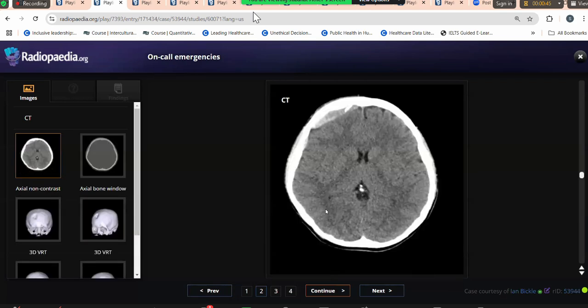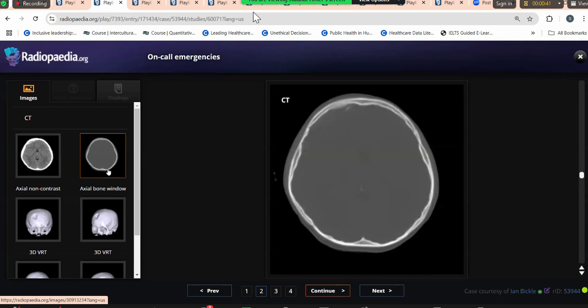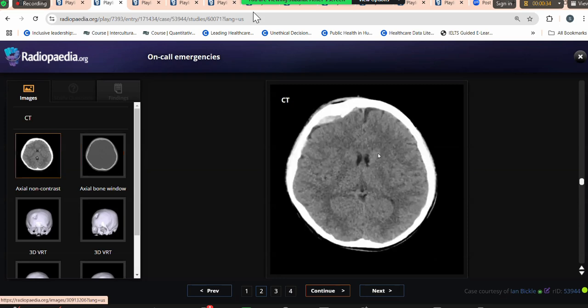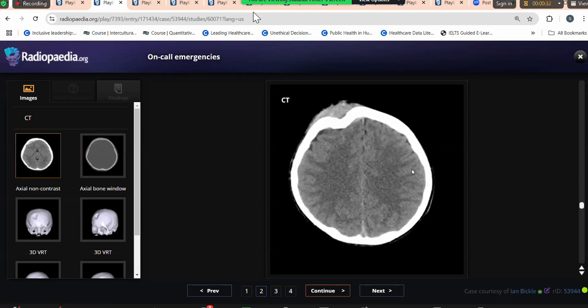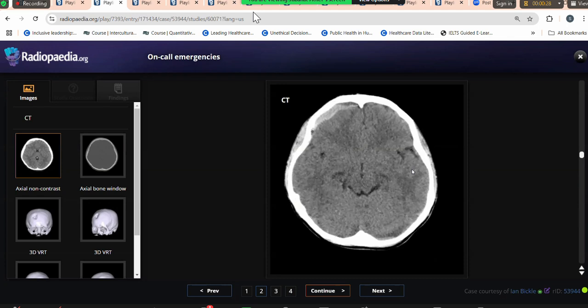I think here the next candidate started, and very happy with how it was done. The very important thing to tell about the depressed fracture, which makes it a real acute emergency, is to involve the neurosurgical team urgently. Don't say extradural, this is subdural, which you rightly said later. Yeah. So this was well done.